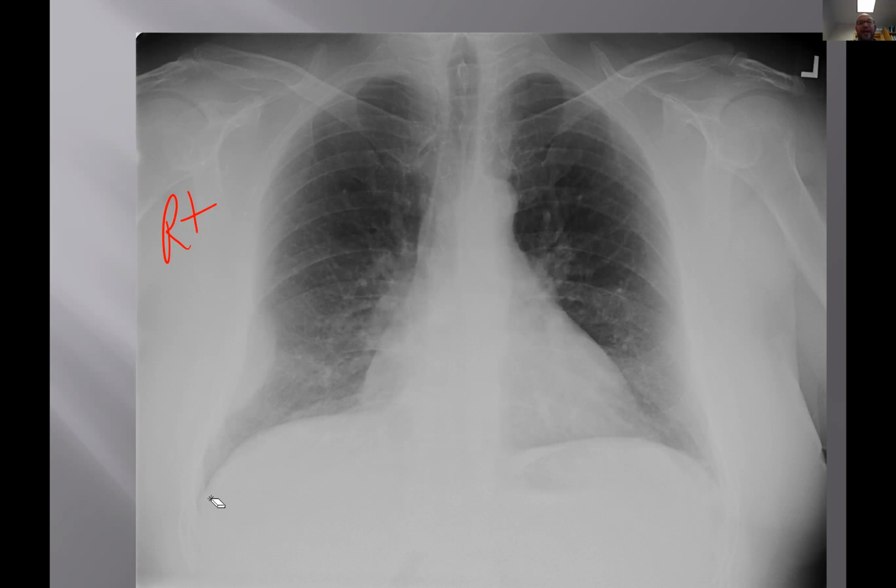It just kind of looks like that. And so that is indicative of a rib abnormality with a soft tissue mass. And sure enough, it was metastatic disease to the rib from cancer, I think from the colon, creating an extrapleural sign. And by the way, this ended up being a sclerotic pedicle as well, but I think that's a lot harder to see.